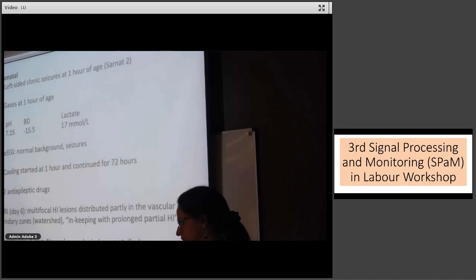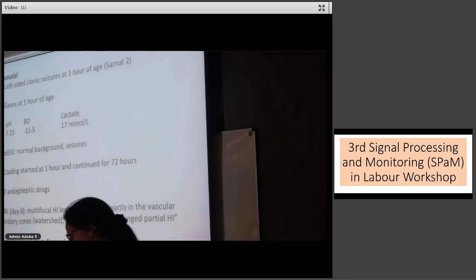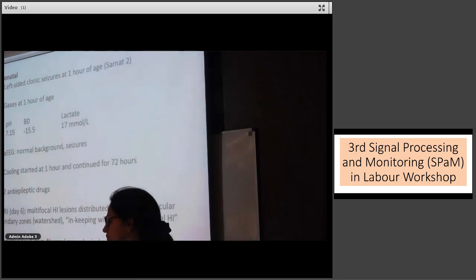The baby suffers on that fetal monitor essentially an acute ischemic event involving its brain. It is injured on the basis of the tracing. The sequence of changes, the decelerations, the rising baseline, the loss of variability, the stable heart rate. At the end, that heart rate's what, 180? Yeah, 180. It is higher by 70 beats over the time of this labor. Okay? And that is the pattern I showed you earlier. That is essentially the pattern of injury.